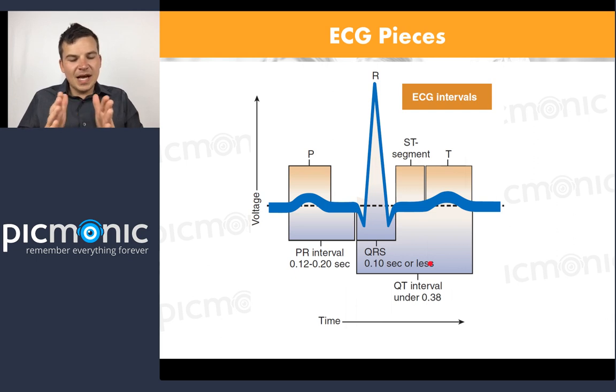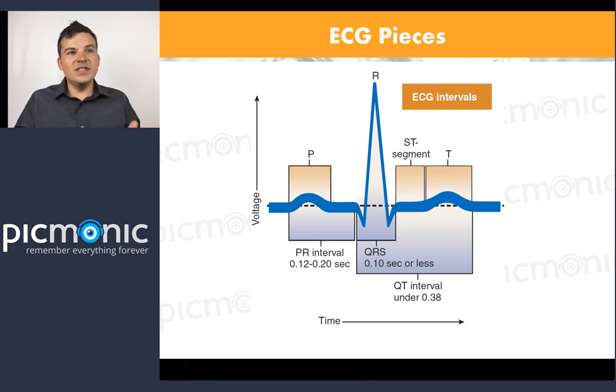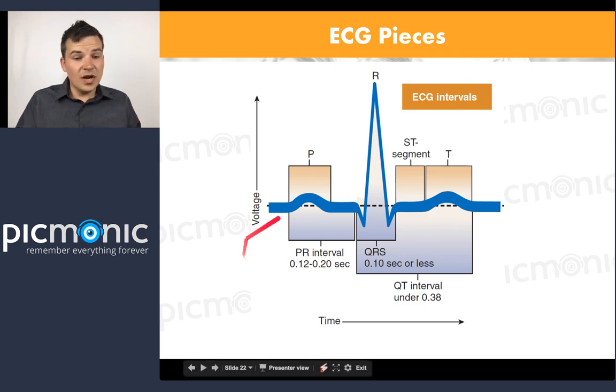And it's because that time gets stretched out, and then it causes this abnormality, and that's where we get sudden death. That's one of the reasons why we have defibrillators in every single school and every single thing now, because of this abnormality. And then of course it needs to be shocked, and the heart goes back into rhythm. And of course there are lots of drugs out there that cause QT prolongation that you need to know about. The ST segment is the most common thing.